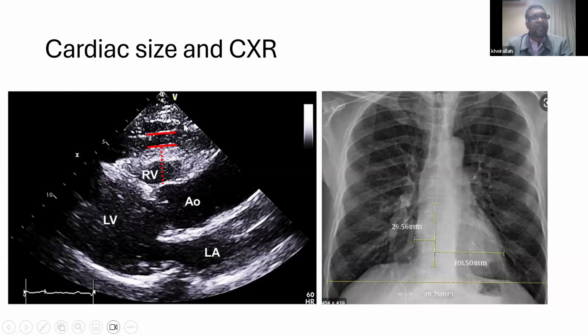It includes the fat, the fluid, anything that surrounds the heart. But the heart proper is just this one. So this is one of the reasons that chest X-ray might erroneously give a false impression of cardiomegaly. Added to this, the orientation of the chest X-ray has a lot to do with the cardiac silhouette and the cardiac size. So be careful about interpreting cardiomegaly in chest X-ray.